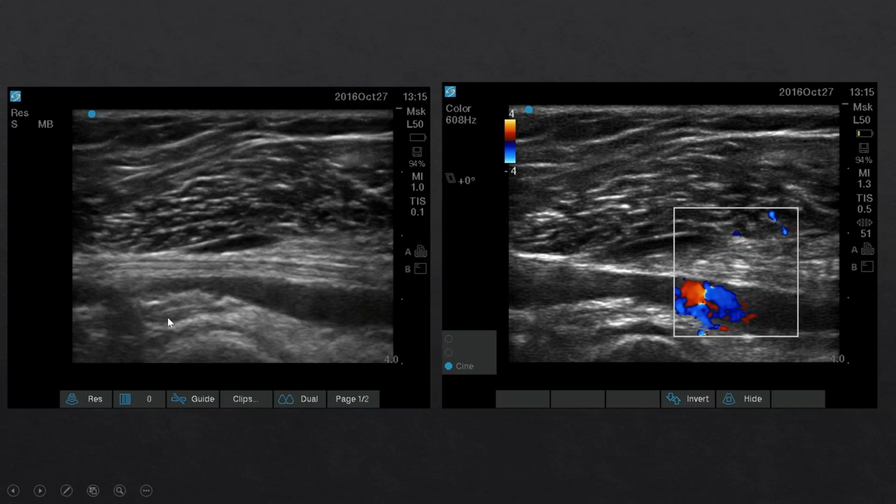Let's look at the second one. Here, the vein appears, suddenly there is increase in the caliber of the vein. And veins can give you appearance of being tortuous. The lumen can change in dimension. There is dilatation somewhere, and they can have bulbous appearance, especially in lower extremity. Even around the ankle and leg area, they may have a tortuous or bulbous appearance.